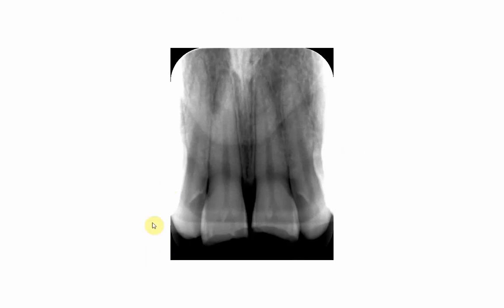Okay, so what do you expect the cause here? It is an elongated image. See the crowns, this is the crown of the tooth, and the tooth appears longer than its real dimension. Now here you can see, if you go back to the previous radiograph, you don't see the nasal cavity, because here we have a reduced vertical angulation. The beam is directed more perpendicular to the object rather than the angle bisector, and this has led to the appearance of the elongated image of the teeth.